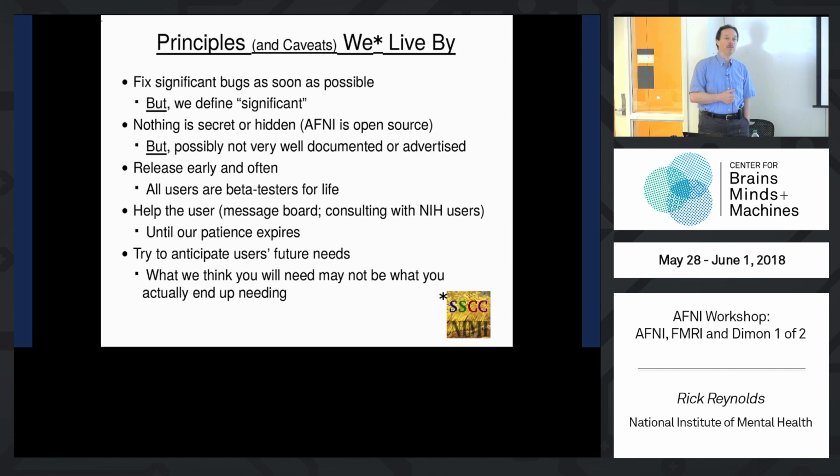So if you ever wonder if your AFNI binaries are out of date, the answer is yes. They'll almost always be out of date. But what we typically recommend is, on your personal level when you're doing your work, you can set up some cron job or something to update AFNI every week or 2 or even every day. If there are no new binaries, it's not going to download everything.